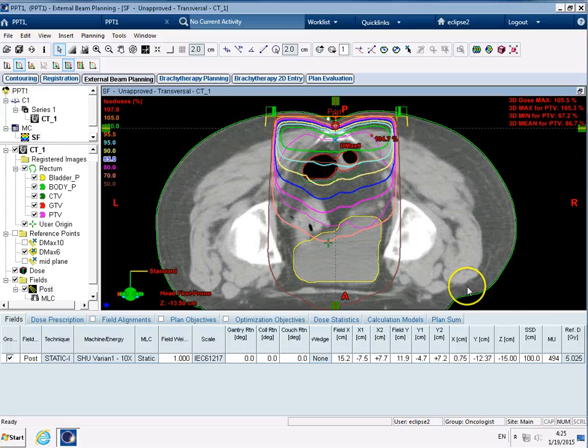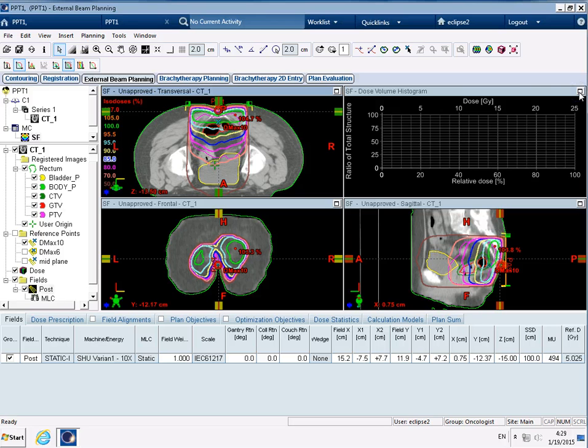And there's two things we're going to have a look at doing. So we're going to have a look at doing as we did before in terms of looking up the dose profile by clicking on there. So do the same as you did before. And then the other thing we need to have a look at is the dose volume histogram at 10 MV.